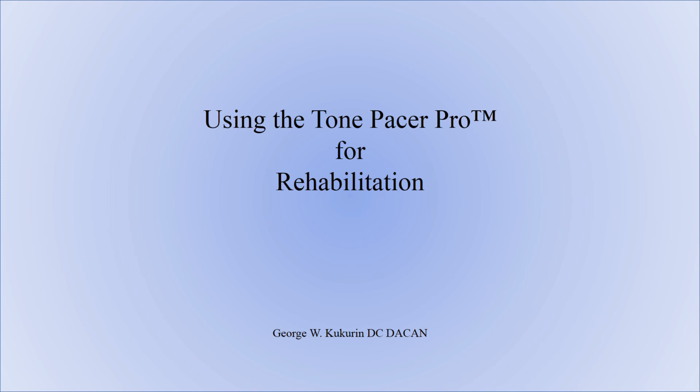Welcome to this video entitled Using the Tone Pacer Pro. In this video we're going to discuss how to use the Tone Pacer Pro application for various aspects of neurorehabilitation. This is a how-to video to show you the features of the Tone Pacer Pro app and how to use them for your patients in rehabilitation.